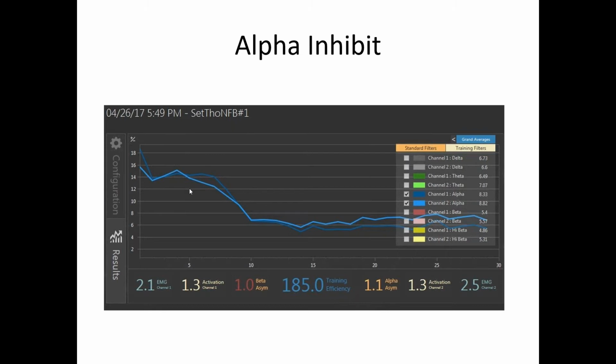And then all of a sudden the alpha will kick in and then it will leave and you'll see a lot of eye blinks or movement while they go through the end of that phase transition and start to recenter into a new task. And that new task may be to continue what they were thinking or move into another task. So in fact, artifacts are proxy measures of phase transitions in psychophysiology and thought, feeling, and motion. I mean, you can get that specific if you want to watch it.